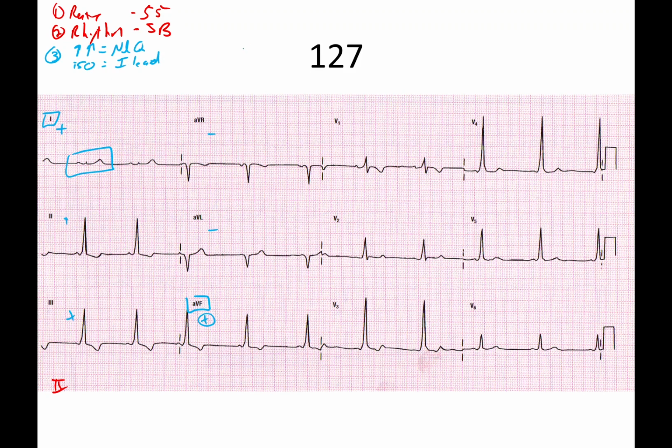So if we spin out our dial here, we say that you are the most isoelectric, who's perpendicular. So if this is 1, then this is AVF, and we're looking in the normal quadrant. So AVF leads us with a positive 90 degrees mean QRS.